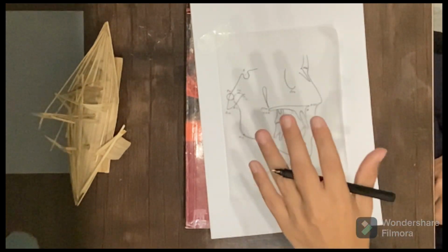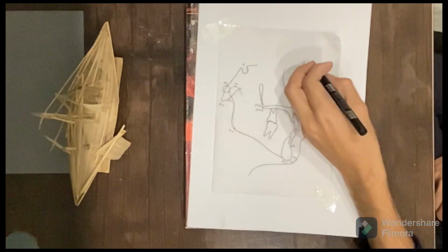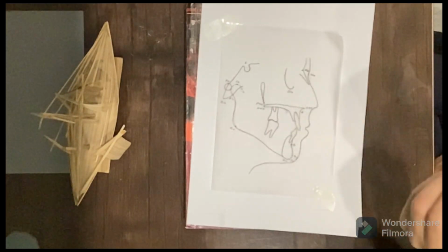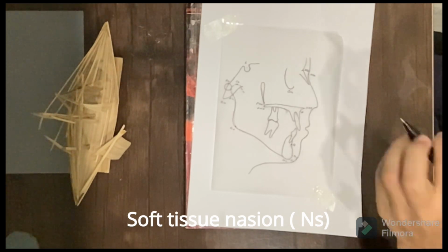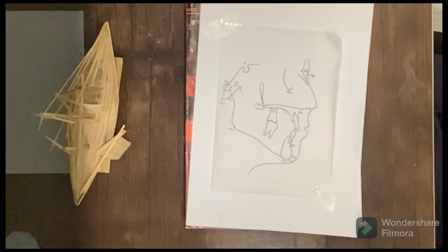Now we will study the soft tissue landmarks which are present in the Ceph. The first one is the soft tissue nasion. This is the soft tissue nasion. It is the soft tissue point at the intersection of the outer contour of the scalp over the frontal bone and the skin over the nasal bone. So this is the soft tissue nasion and it is marked by NS.